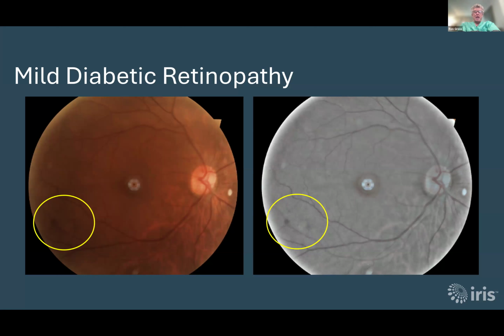get worse. So it's really any retinopathy, diabetic retinopathy tells us that it's an opportunity to change that patient's sugar control, because it's saying that it's not good enough and that damage is already present. Not severe at this point, but as we'll see, that's what will happen unchecked. So as the outpouching of the blood vessel continues, go on to the next one.